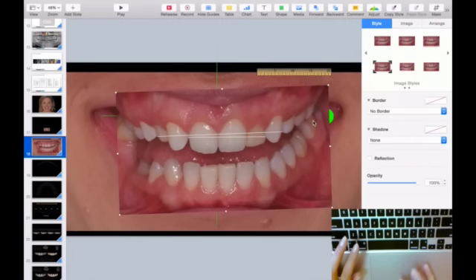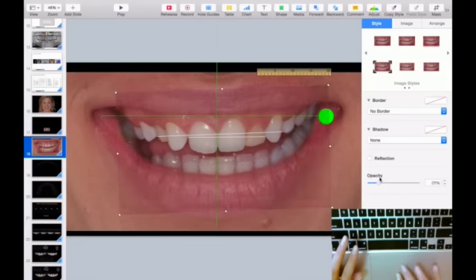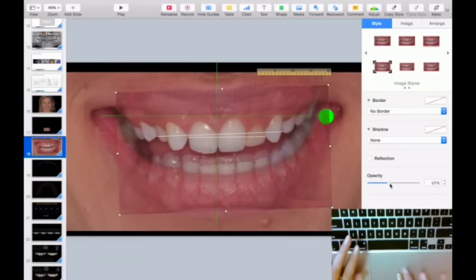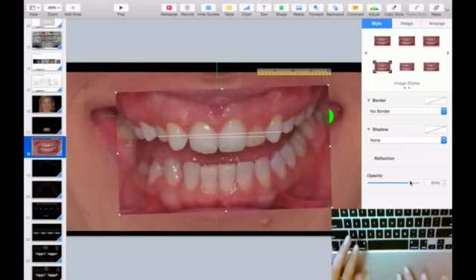So now I'm just going to check here. I can click on the picture and I go here to Style and I see Opacity and I can make it so I see if I have this picture on the right place, and you can see that it's pretty much it. Okay.